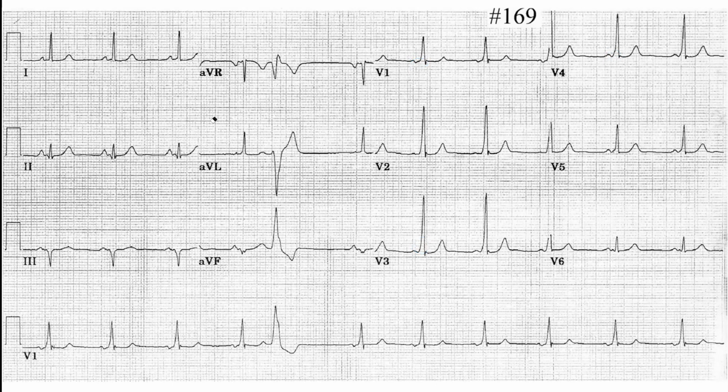So this shortening of the PR cannot be seen everywhere. Here it looks okay in lead 2, and in lead 3 you don't see it.